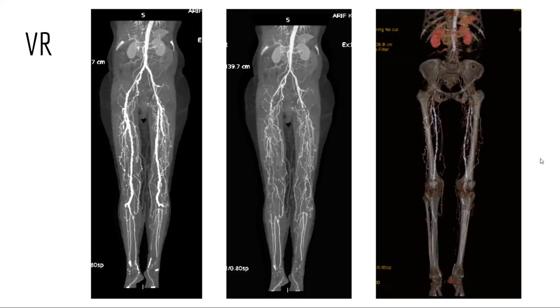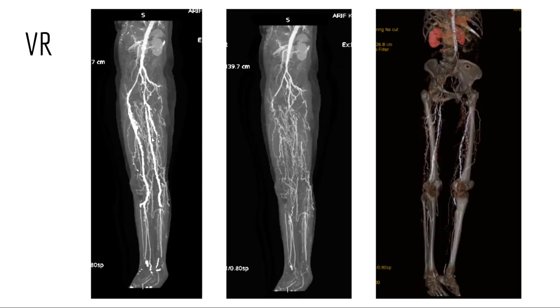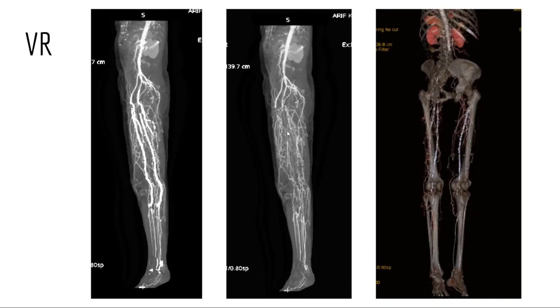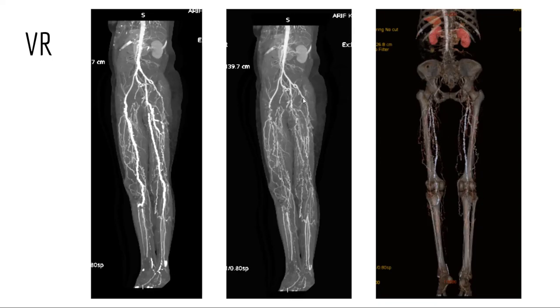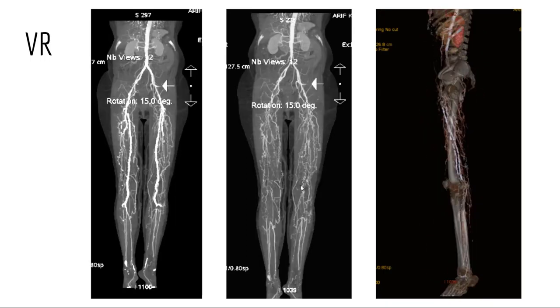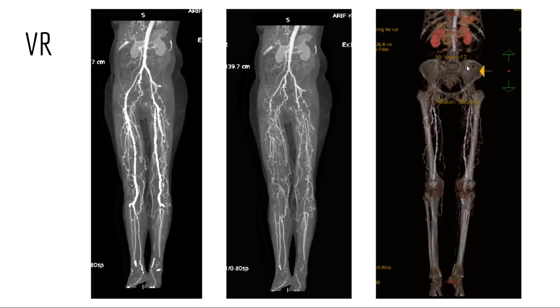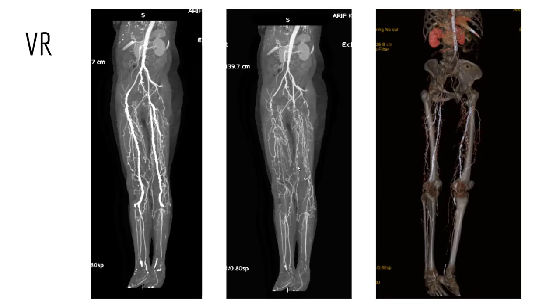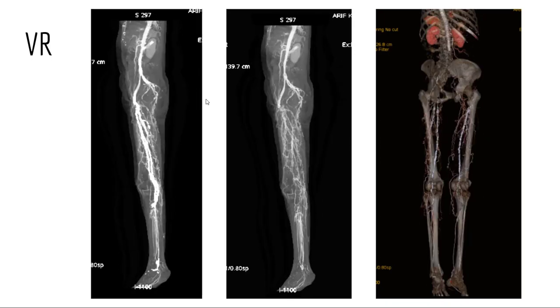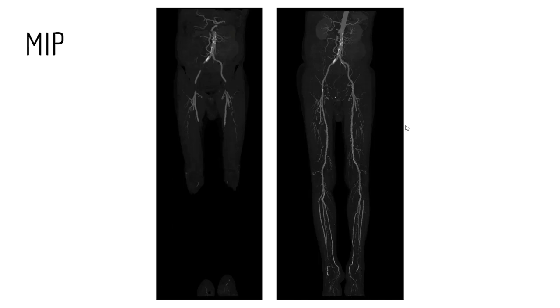but we just don't know until we scroll through all the images. Volume rendering: the two on the left are the same patient with calcifications and then with calcifications removed. When the calcifications are removed, you can see that this patient probably has chronic total occlusions from the common femoral artery bifurcation all the way to the tibials, and that's supported by these collaterals. And then on the right, we're seeing aortic occlusive disease. These are great for the patient and for the surgeon and for us too, because they provide a really nice overview of the overall disease, especially the collaterals. Wow, I love those collaterals.